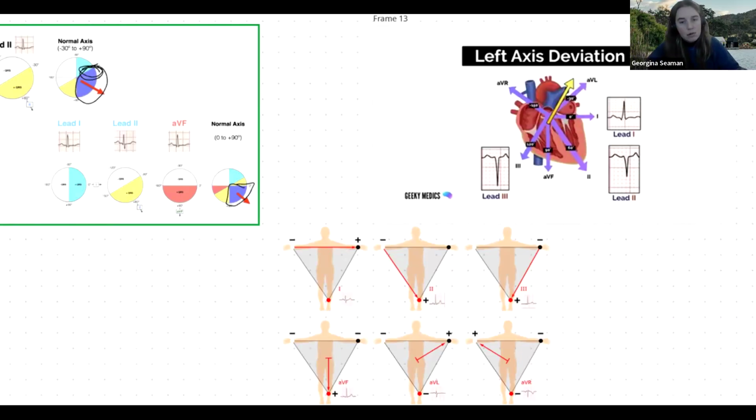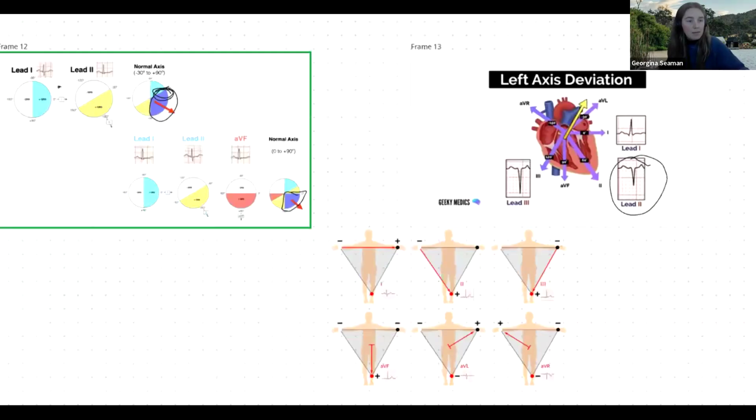So if lead 2 is negative, then that's our big warning sign, because that's either happened potentially, as James's group said, because there's been a prior infarct or some reason like that. So we're seeing that mostly the direction of the voltage is happening away from lead 2 in the first instance, which can be a sign of that. Now we combine that with our understanding of what's happening in lead 3, 1, and AVF.